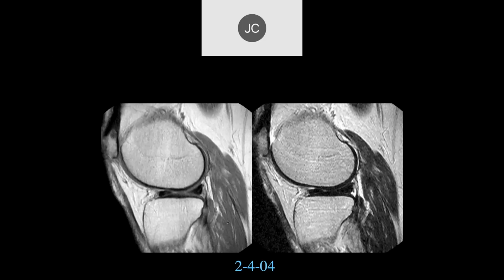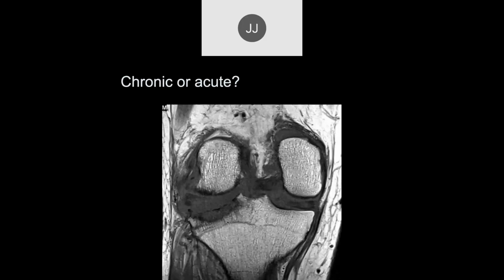If you look at a muscle distally, it looks like fatty atrophy. Am I right or wrong, John? You're right. Good. So this patient was not walking pretty much. I don't see how he could walk on that unless he was a drug user or something.